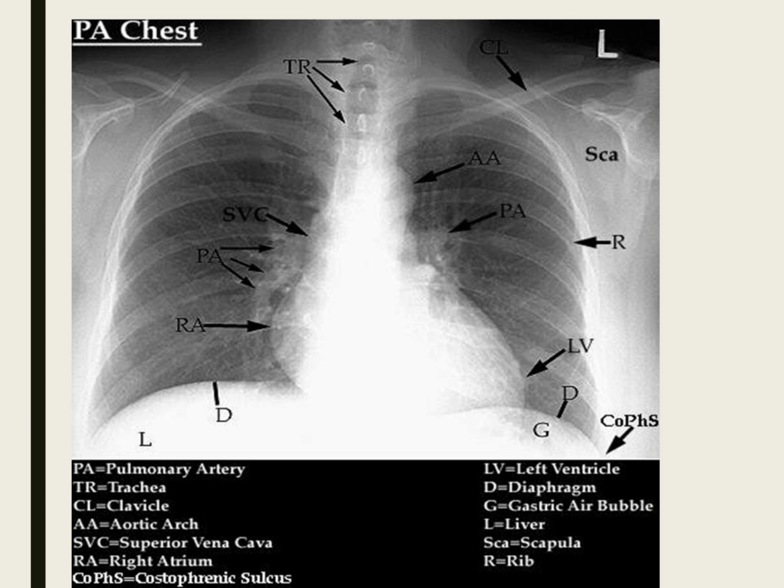Normally when I look, first I look at lines, technically, right? Are there any tubes, any endotracheal tubes? There's nothing on this patient's screen. So I'm looking at the airway, normally the trachea primarily.